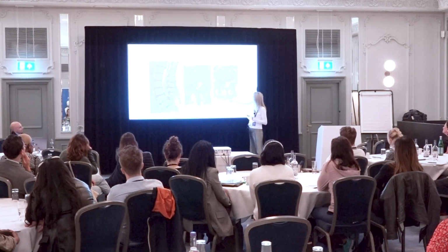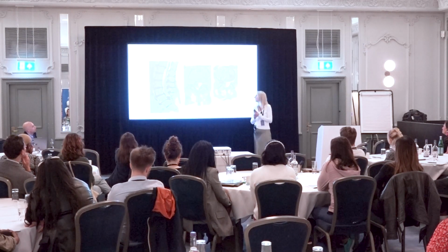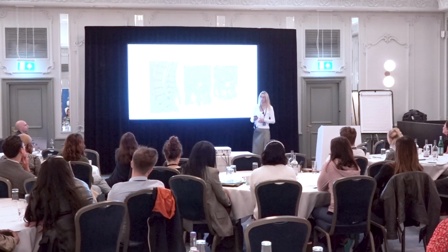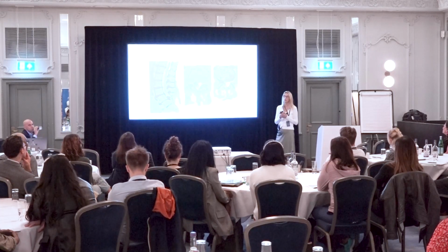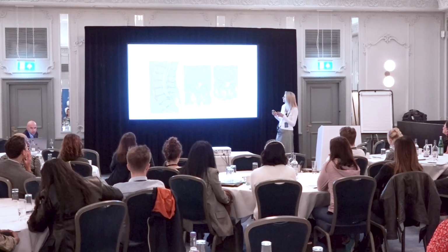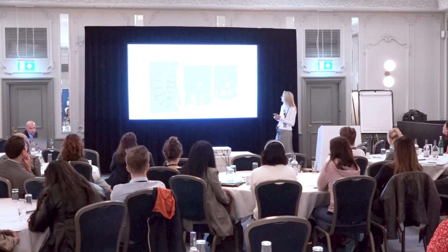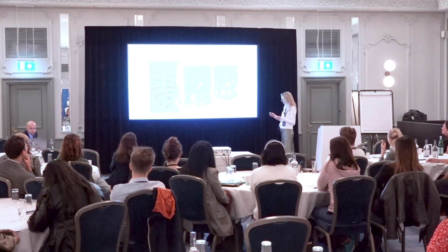Now you may have spotted that you can see that the surgeons have been hacking away with knives, and you can see a little bit of fluid. You always see little bits of fluid after surgery. You can see also here that there was an epidural collection. So this patient actually presented after surgery with acute symptoms. Surprisingly not cauda equina syndrome because there was quite a lot of compression, but of a right-sided radiculopathy. So we always look after surgery for recurrent disc and hematoma, and in this case there were both.